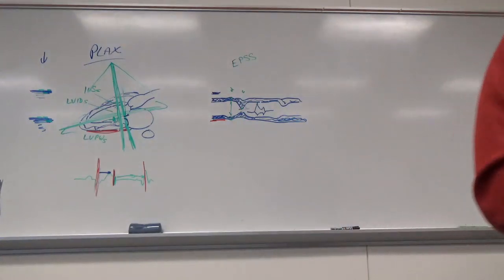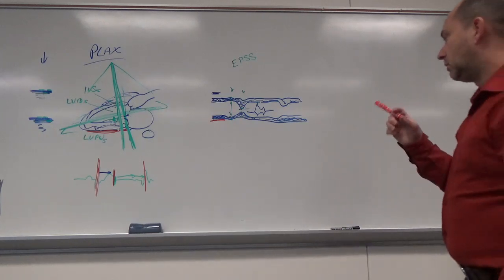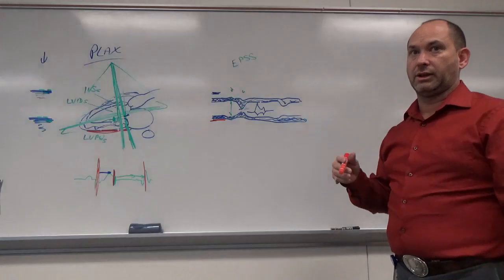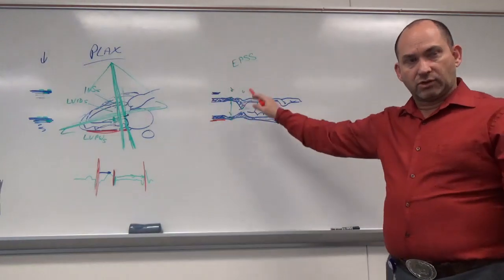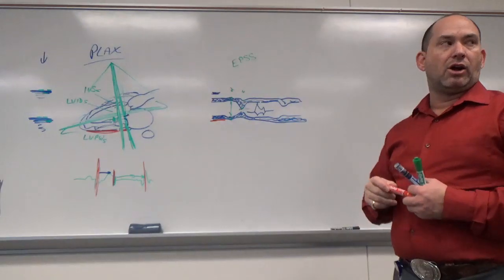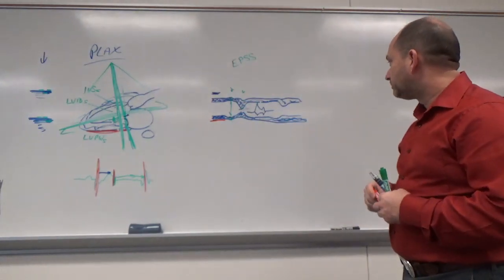And you'll actually see that on M mode? Absolutely. That's a very simple measurement, but it tells us some information that we'll talk about later. It's really looking at systolic function and how big the chamber is, how dilated it is. It's not done in 2D, it's only done in M mode. Not all labs do it, but it's another tool for your tool belt, so to speak.